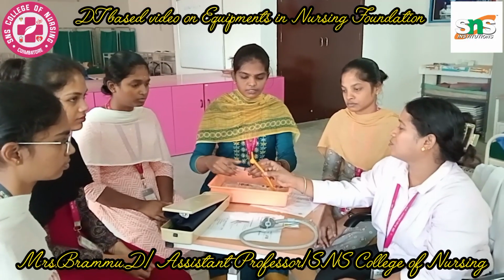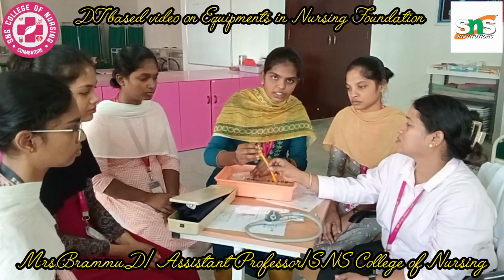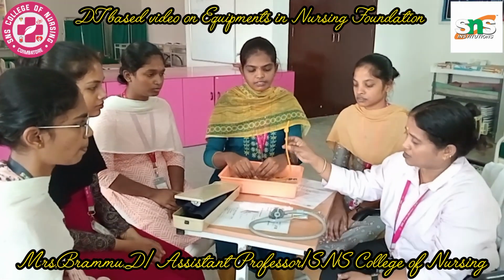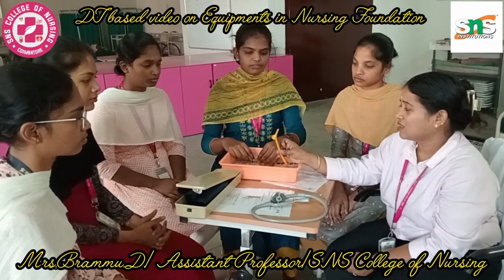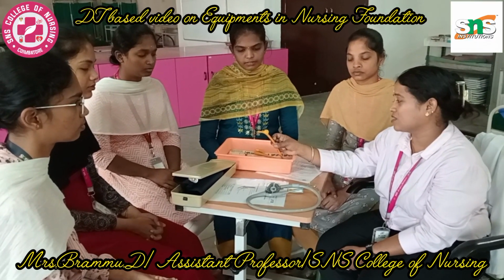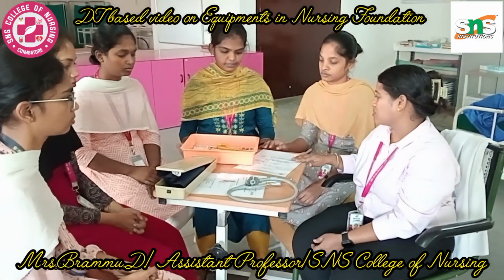And the end of the port. The end of the port is bent, and it has two holes on the two sides of the following tubes. So this is how a Foley's catheter looks. This is a rubber catheter. You also have silicone catheters if the patient is going to be using the catheter for more than 7 days or so. Thank you for that superb demonstration.